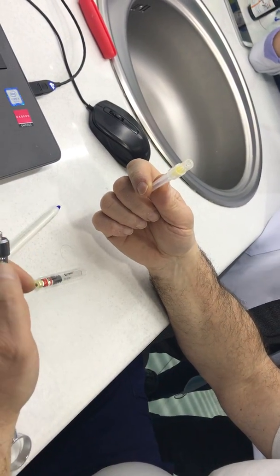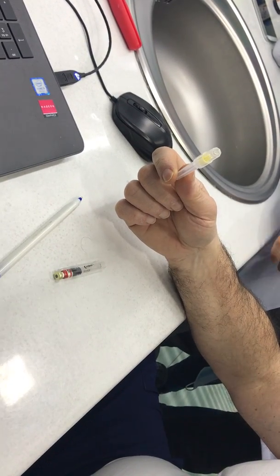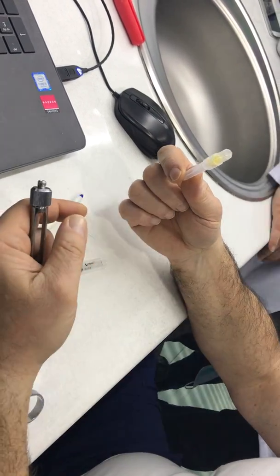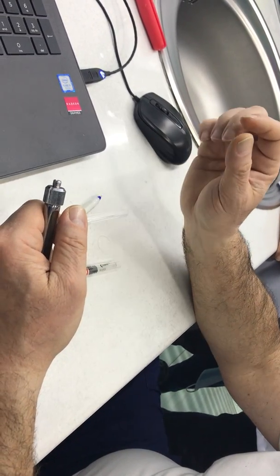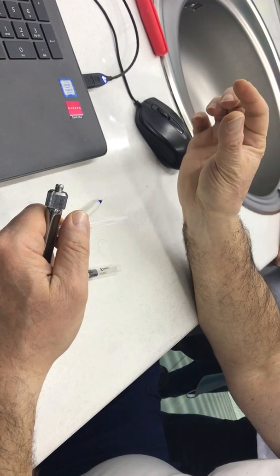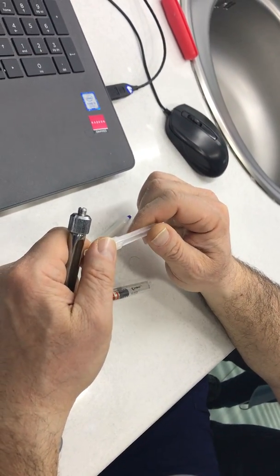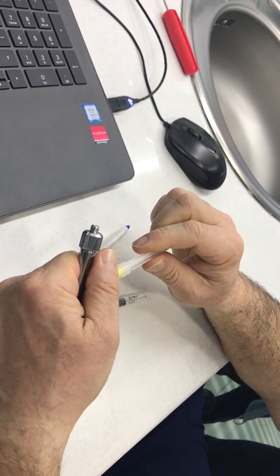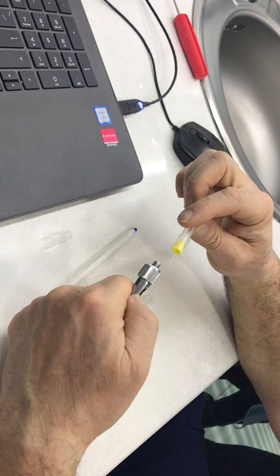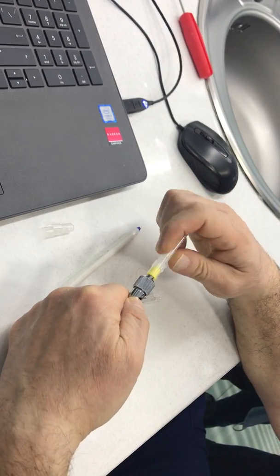The short we use for infiltration, anterior and the areas which need infiltration. The needles, so we have number 25 short, till we reach number 35 to 37 millimeter long. This is the long needle. How do you fix it? You put your needle inside in this way, turn it.